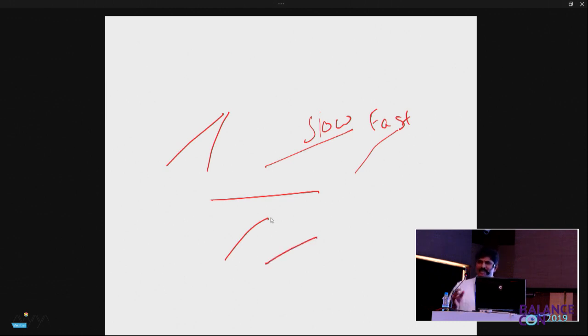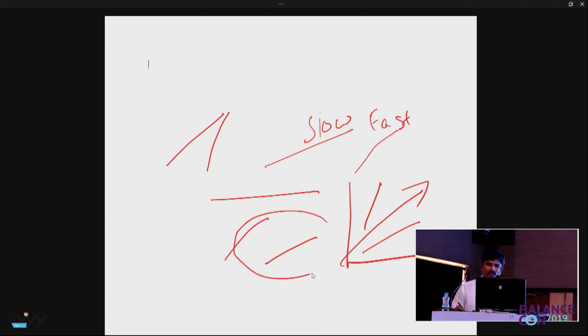You see 2 segments and tell of the 2 segments which is fast and which is slow. It is not like there is one particular trajectory line, where anything below this is slow and anything above this is fast. It is not like that. It is always relative to one another. These are the 3 alphabets.